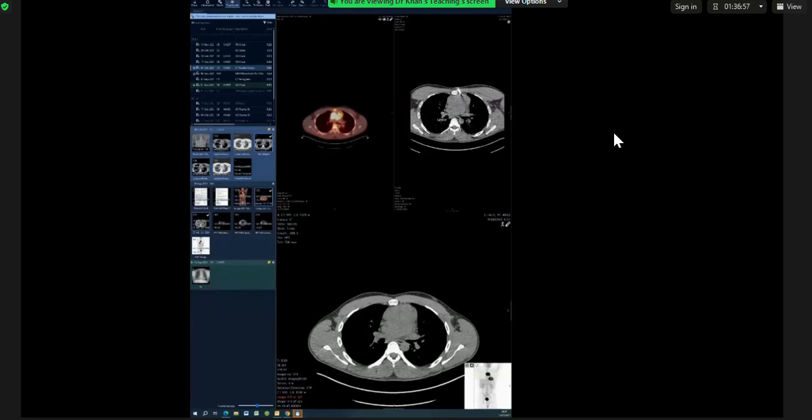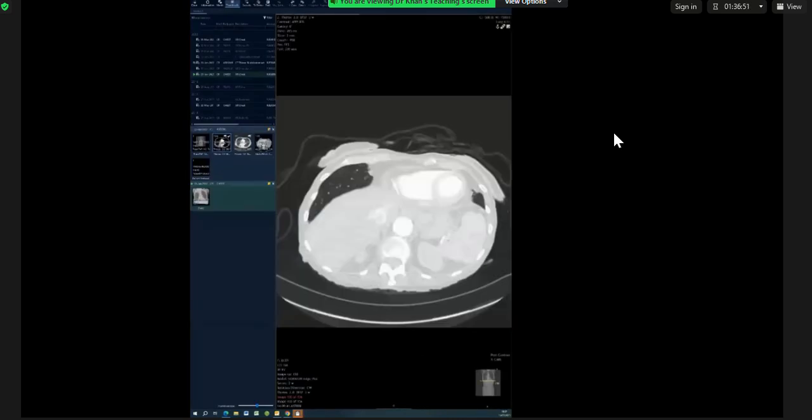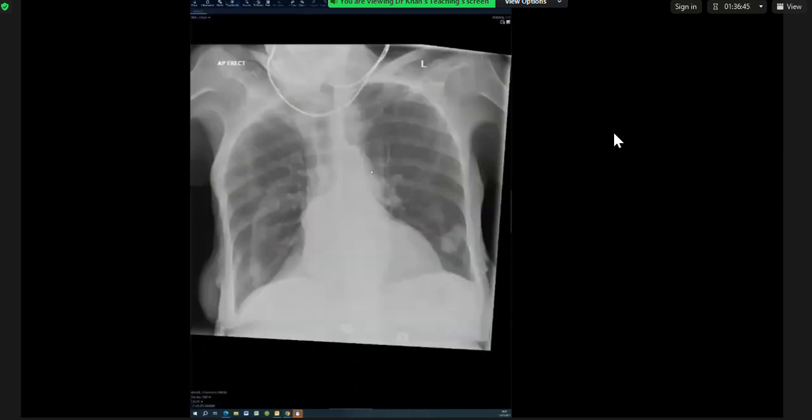let me bring up the first one, and I'll pretend I'm you. So I'm trying to figure out the X-ray while I'm doing it, and I'll tell you how to approach it as you're thinking, because that's the first problem we have: straight away we don't know what it is and we're thinking and speaking at the same time because we don't want that awkward silence. And it's very important to say what we're thinking, because that thinking process, if it's correct, even if your diagnosis is wrong, gets you a pass. So if you describe what you see appropriately and you're thinking in a logical manner, even if you get to the wrong answer, it's still a pass, rather than saying, magically, the right diagnosis, but your approach was all wrong. Nobody's going to pass you for that.